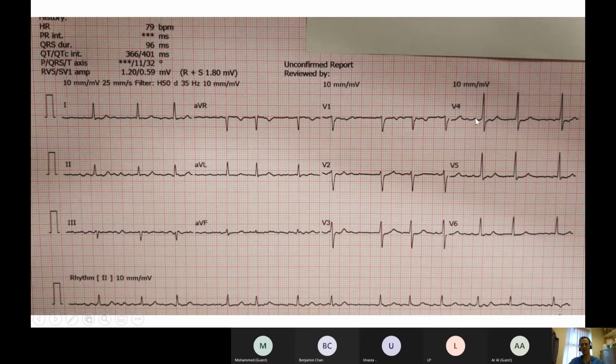So if you could see those bumps occurring throughout the trace, I might buy this as an atrial tachycardia or possibly an atypical atrial flutter. But you can see immediately as you move on to the next T to P segment where the baseline is flat, that it is just noise and irregularity, and these just happen to look a little bit like P waves. So this is atrial fibrillation. You've got a profoundly irregular RR interval, no question about regularity on that ECG.